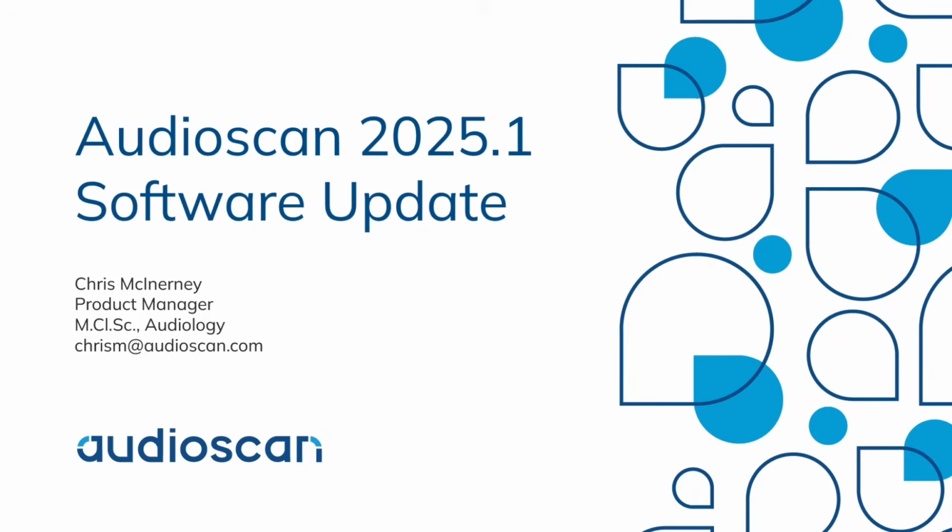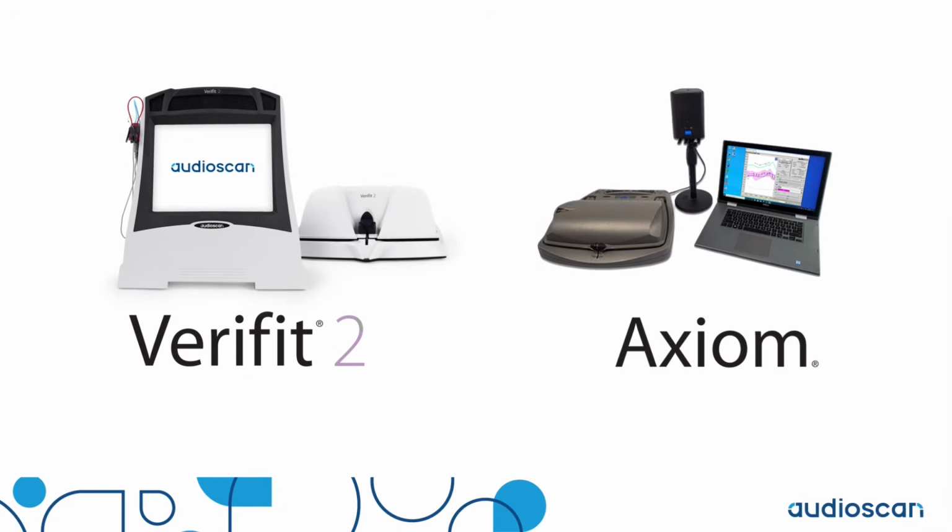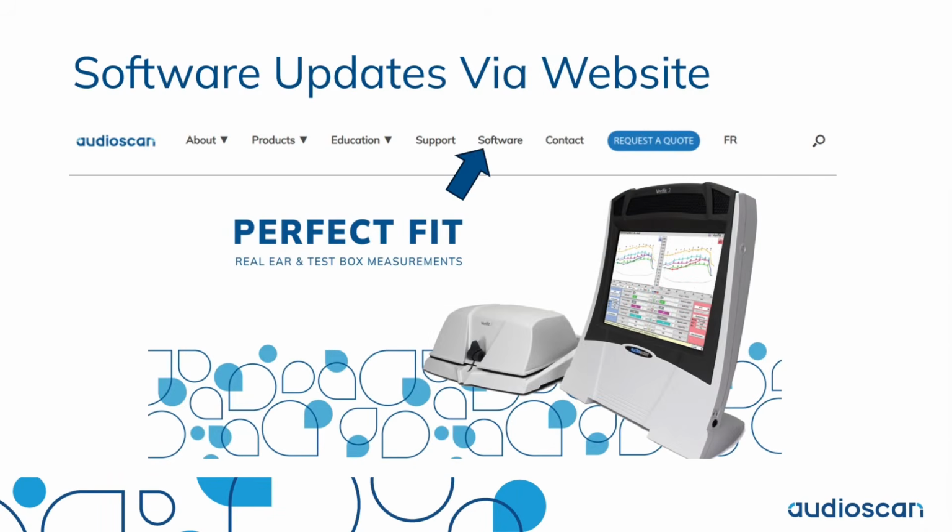We've added new features to Audioscan software for our 2025.1 software release. This video covers what's new for the Verifit2 and Axiom. As always, the no-charge software update is available for download at audioscan.com.